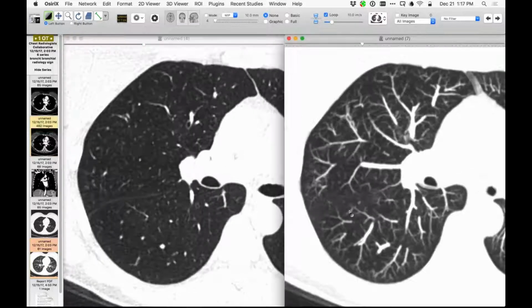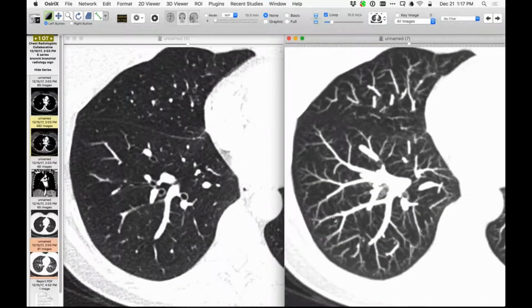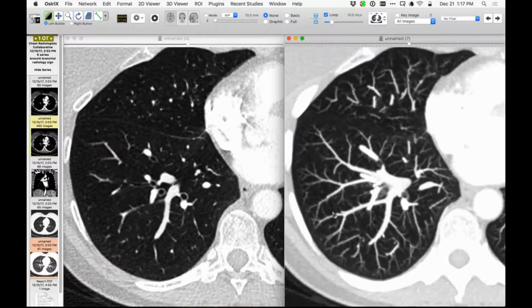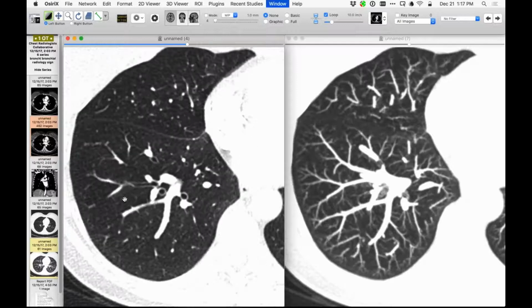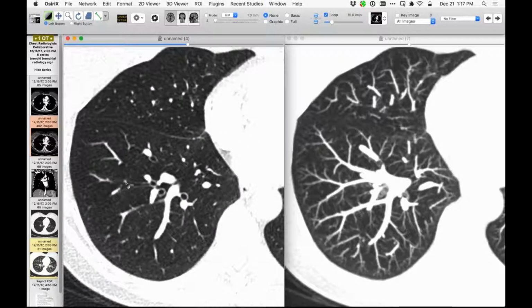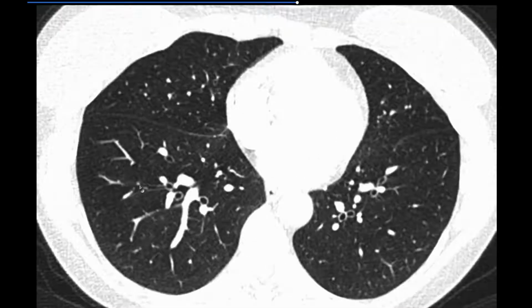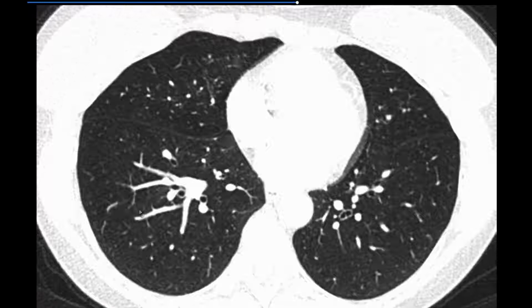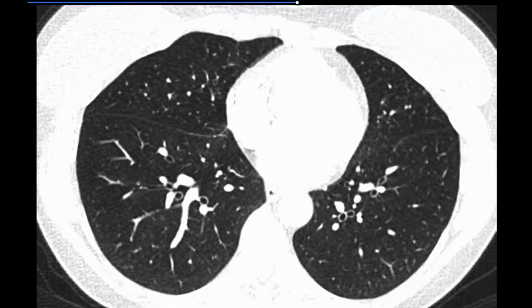And I always tell folks that the importance of knowing that is when you look at a CT, and we image a lot of patients follow up for cancer, that when you see nodules like this one, but it's adjacent to a vessel, look very carefully at the thin cuts like right there. And if you see that that little white spot is right in the lumen of a bronchus, like right there, you can pretty much conclude that it's not a metastasis. I see that quite commonly. I'm sure you folks do as well, but I find it very helpful to note that it's actually in the lumen of a bronchus.